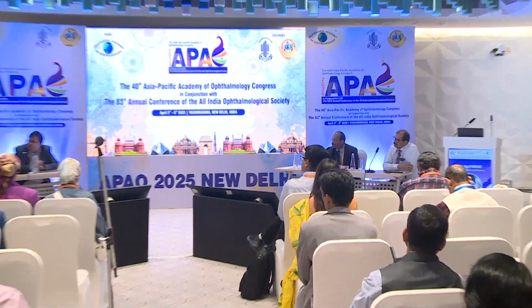One important thing is that in AION also, OCTA plays a very important role. Now with anterior ischemic optic neuropathy, I'm not doing any kind of fluorescein angiography. I'm diagnosing my patient on OCTA. With this, I'll ask Dr. Ritesh to conclude the session.